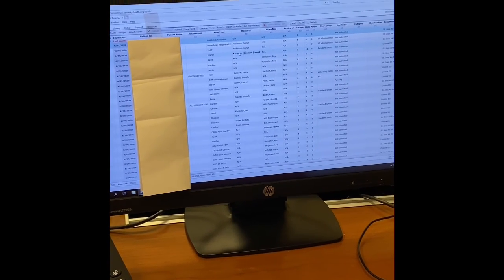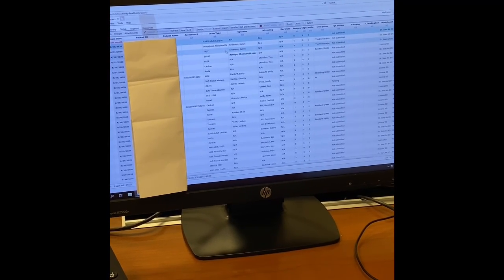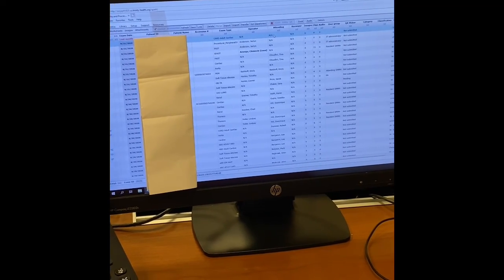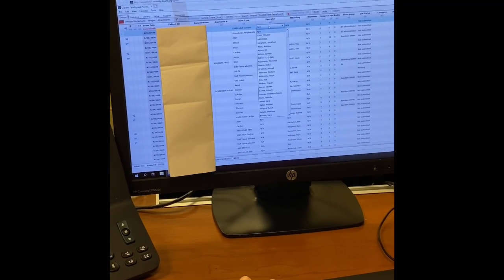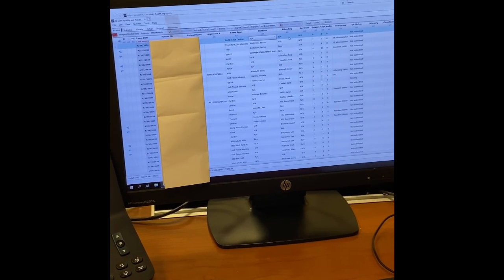If there's a study that got transmitted to QPATH without your name on it and without a patient identifier on it, you will see that it says NA. If this was your study, you can manually add your name on it by 2 slow clicks and finding your name in the drop-down list under the appropriate column. That concludes the QPATH tutorial.